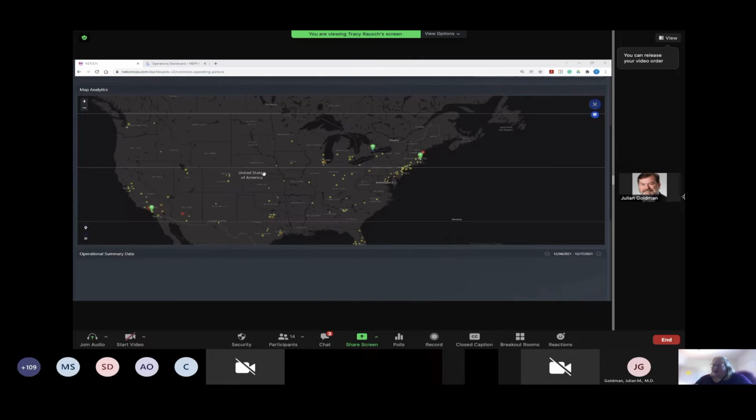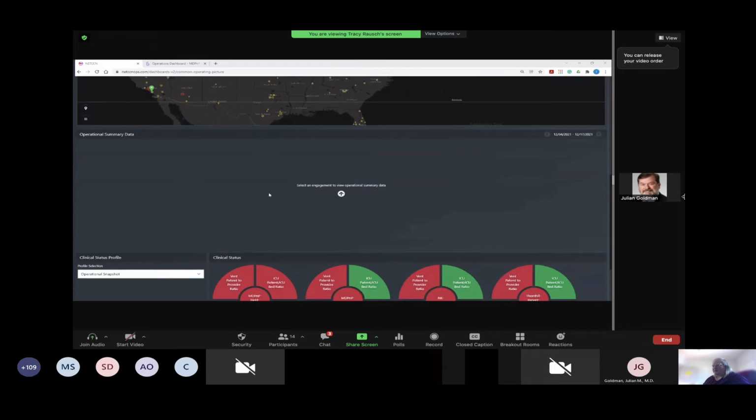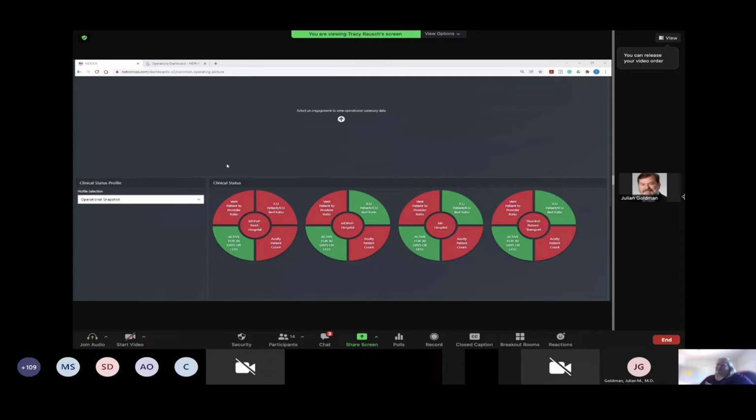As you've seen from these demonstrations, we are controlling devices from Massachusetts to Orange County and from Washington State to Toronto. So that was the hospital sites that you see that's available. Part of this also is actually looking at what is the health of those clinical locations and what's going on with them. And as you can see here across tiers, we're looking at different factors and different variables to make that determination of what the health status is.